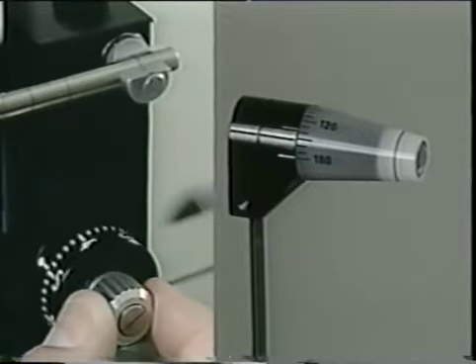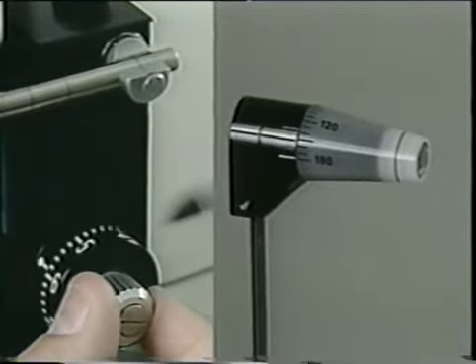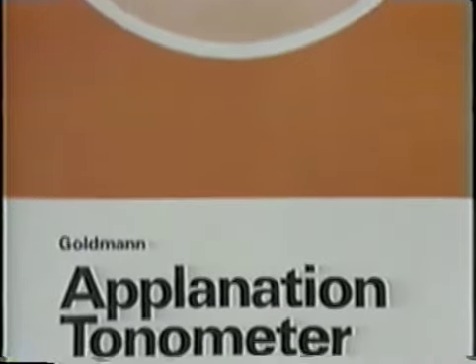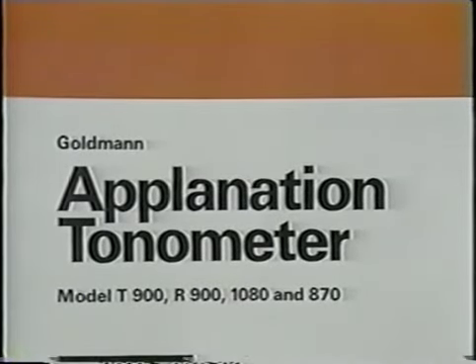At each stop, the tonometer head should move only plus or minus 0.1 grams of the settings. The necessary equipment and instructions for this are included with the applanation tonometer. If proper calibration cannot be achieved, the tonometer should be sent to a service center or the manufacturer.